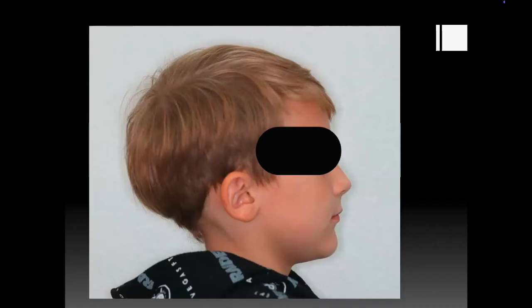How about the lower jaw? What information can we get from it? We talked about the convexity of the profile, but ignore that. What other features? Hyperdivergent? Like a lower, longer third, possibly. All right. If I had to pick between shorter or longer, I would pick longer. Facial height in general looks pretty normal to me in this image. What other features can tell us anything that's happening with the mandible?